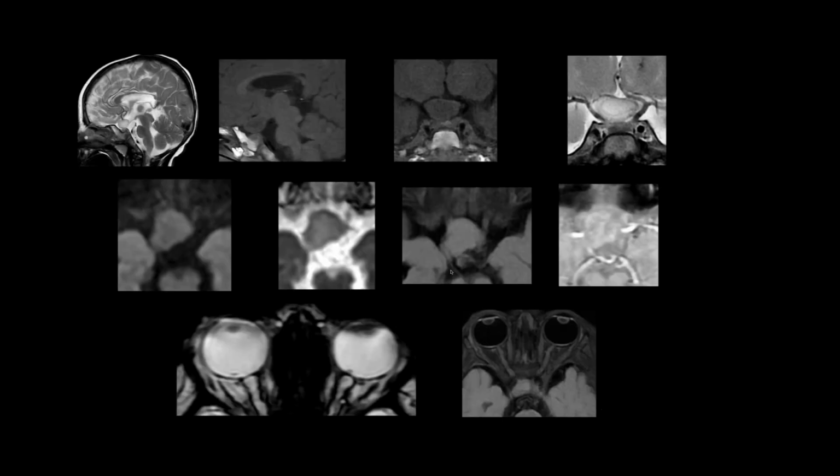Is it a tumor? I would think it's a tumor. Though contrast wasn't given, I'm pretty confident it's a tumor. Maybe you can get a contrast study or spectroscopy, but I would think it's a tumor. If biopsy is possible, then biopsy should be done. It's a tumor in the broad sense.